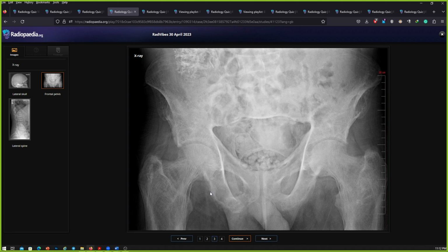Okay, so this is a case of renal osteodystrophy secondary to failed renal transplant and secondary hyperparathyroidism with salt and pepper lytic lesions within the skull and vertebral changes and renal super scan. So I'll correlate with the history of the patient and the clinical concern of any acute symptoms, and refer the patient to the nephrology team. Okay.